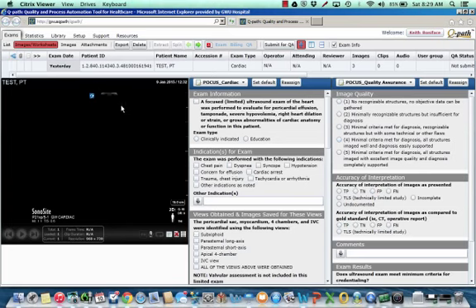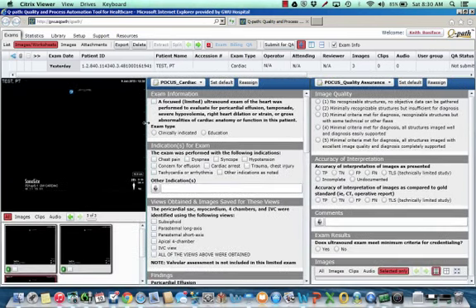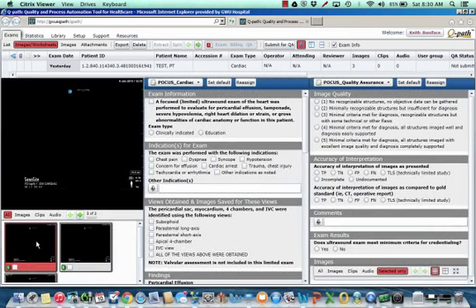Now you can see here, remember we had 3 thumbnail images, now you only see 1. You can resize this box a little bit, you can drag this over, and then at some point it becomes small enough where you can find the thumbnails and you can scroll your way through these thumbnails and the videos will play automatically.